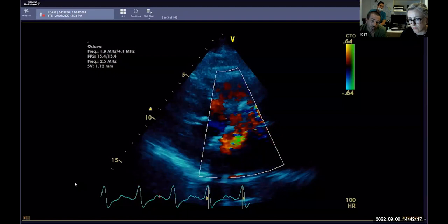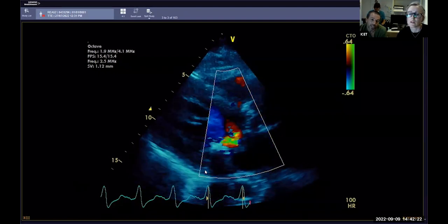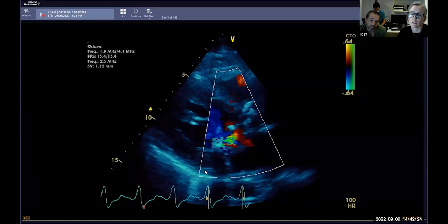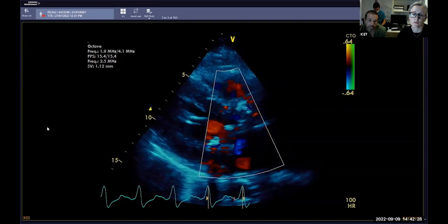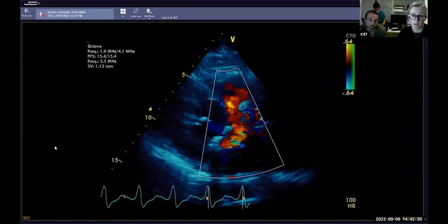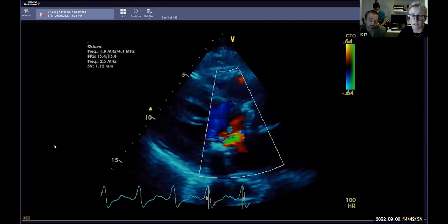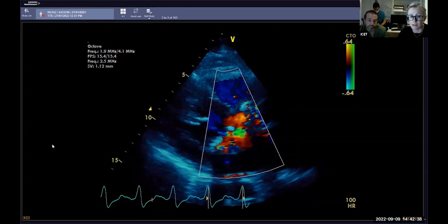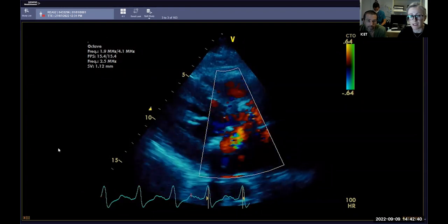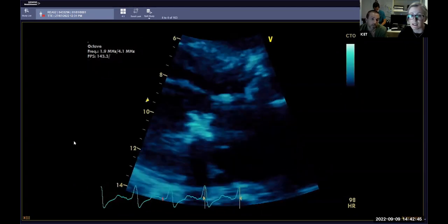Aortic regurg there probably is. Again, there's variance going into the left ventricular outflow tract and aortic valve, suggesting that you're going to have increased gradients flowing into there. So this could be mixed mitral disease and aortic valve. So with degenerative MAC, severe mitral annular calcification, would you be expecting to see severe mitral stenosis like you did with the rheumatics?